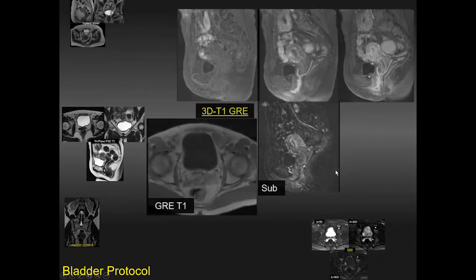After we do the DWI, we do the gadolinium enhanced images, and it's typically done as a non-contrast quick run followed by dynamic images where you start at 30 seconds and then can scan for 3 to 4 runs following that, and then do a delayed high resolution image. It's also important to get subtractions once you give the contrast.